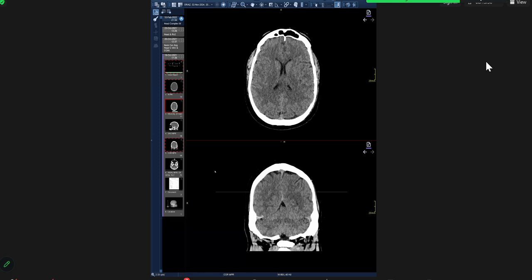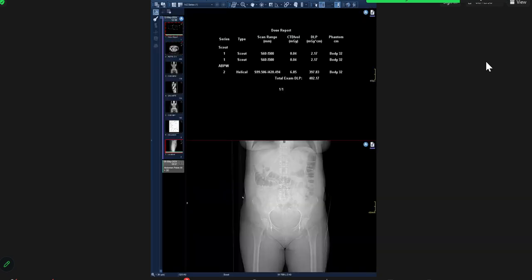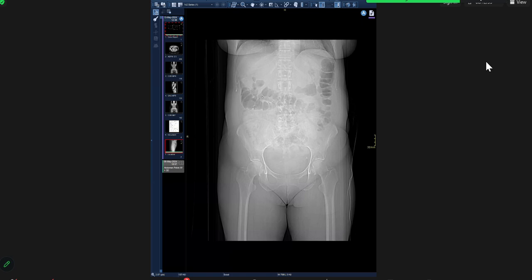Someone is asking, can you please briefly tell small and large bowel obstruction, many points in a nutshell? So basically, whenever you have a bowel obstruction, if you can see the scout image, it is very, very helpful. I'm going to go back to that case. I didn't see the scout, but I think I should look at it. Let me see what was the name of that patient. Okay, Dubey. So this is the scout of the patient. This is the colon, and this is the small bowel. So the scout doesn't help us much in this case.